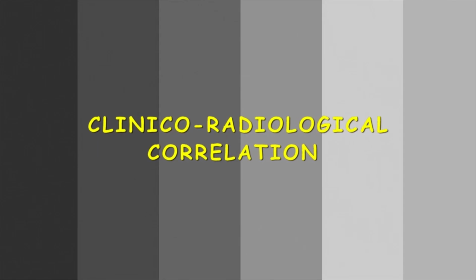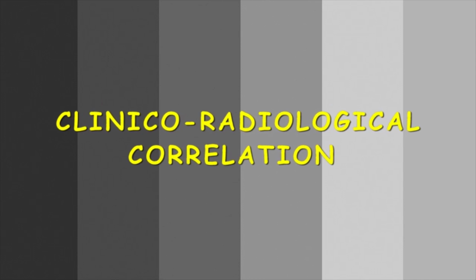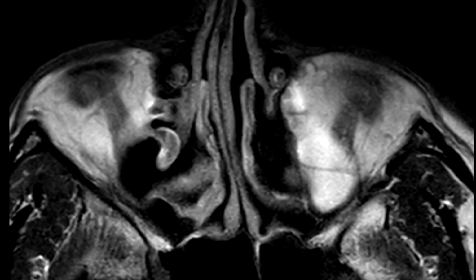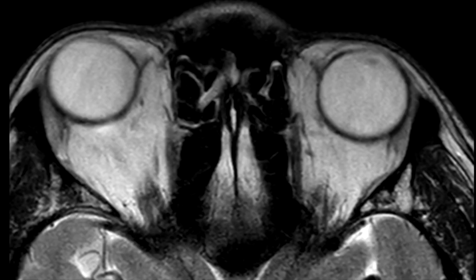As clinico-radiological correlation is mandatory to understand, let's discuss some of the major pathologies that we come across for a deeper and better understanding. Here is a 34-year-old male with right eye axial proptosis, disc edema and choroidal folds. On MRI, a well-defined intraconal mass causing right-sided proptosis was seen, causing compression on and displacement of the optic nerve supranasally.